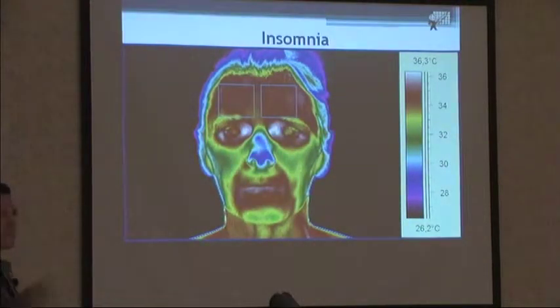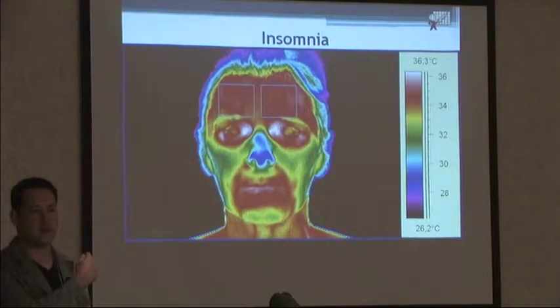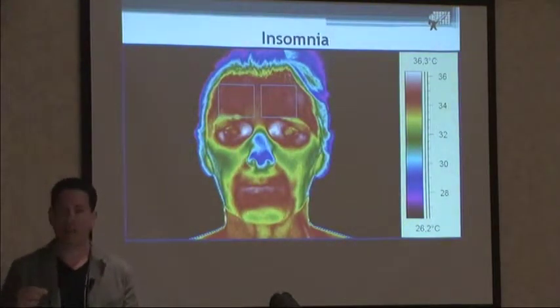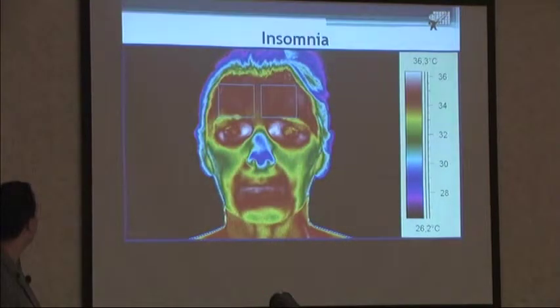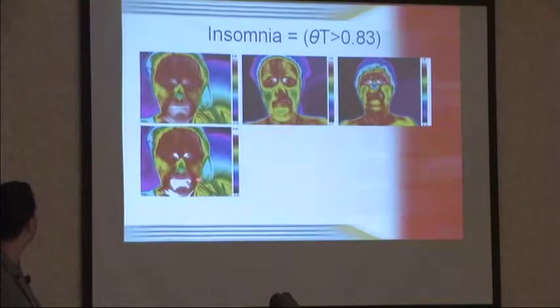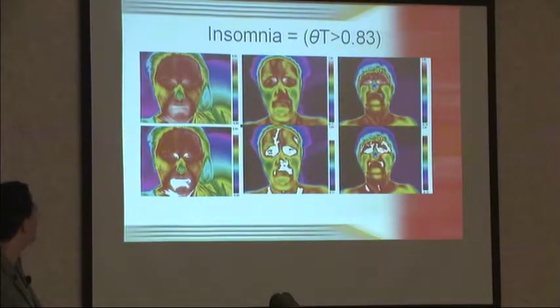And these fibromyalgia patients, most of them have this. It's very common. They have a sleep disturbance. So you see the cold sign, cold hands, and the panda eyes, like a panda eyes. And we studied the delta T. There's no difference, but you can see the panda eyes here, normal eyes with isotherm.